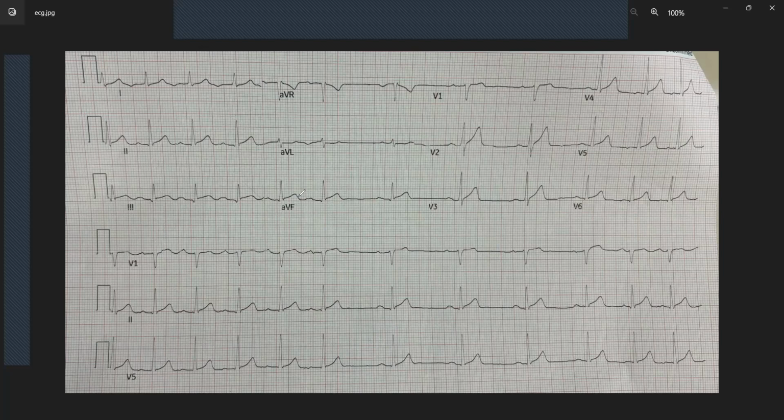So the next thing we've got to look at, and remember, these are all our rhythm strips over here that we're looking at. So when we were looking through all of the rhythm strips, remember, we couldn't see the extra P wave that would definitely tell us that this is a Mobitz, but it's a possibility that it may be there, and there's an orientation problem that's going on. So if we look at the septum, look at V1, V2, we can see a slight ST elevation here.